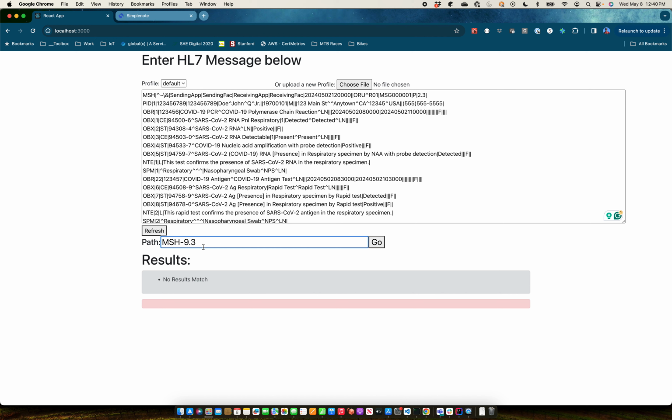So it's up to the user to understand your HL7 flavor and know where you want to extract information. And it's very lenient in the sense that you're never going to have to handle errors if the information is not there. In most HL7 messages, a lot of fields are optional or required empties and things like that. So we decided not to throw any errors when you provide a path that doesn't match.